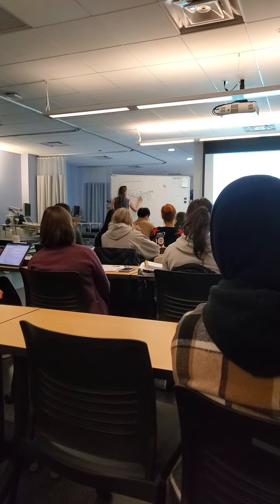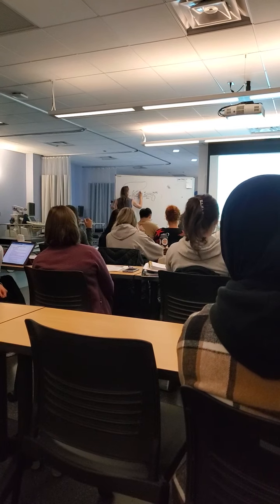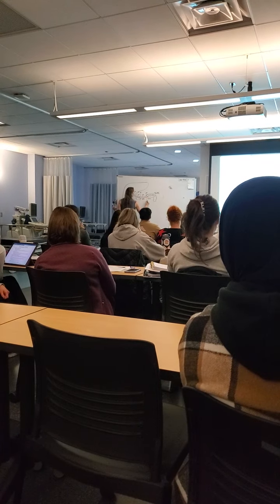So mid is what we consider pre-pancreas. So this is going to be our proximal up here. Mid is going to be somewhere in here. And then our distal is going to be at that pancreas.